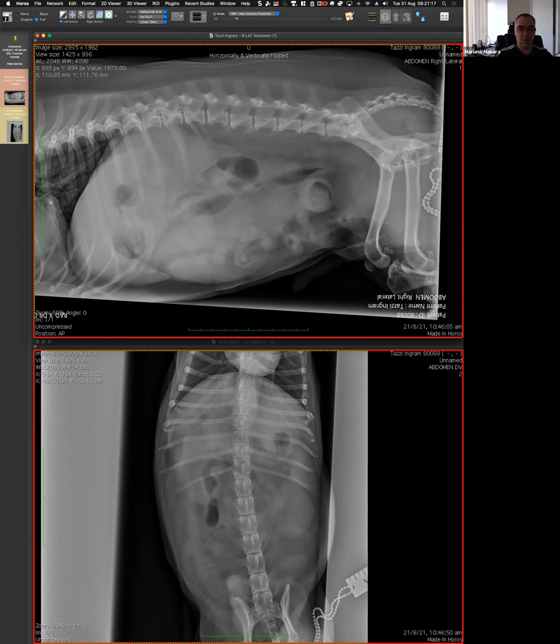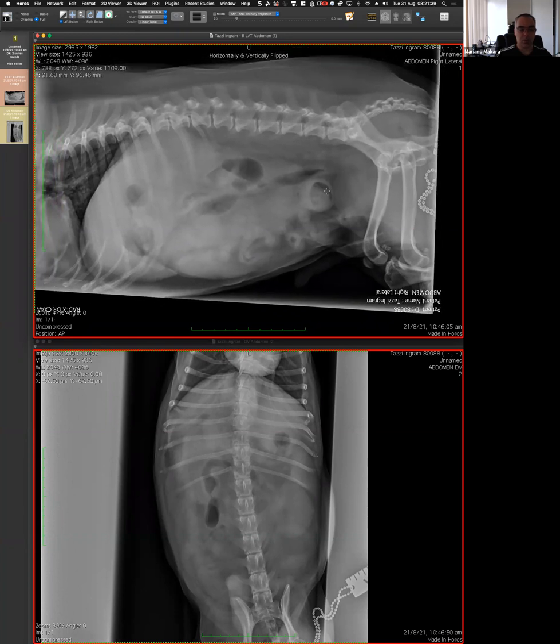Is there anyone willing to take on that and try to say you agree or disagree or support that, and try to push that idea about this? Or what could it be? So we said it looks odd. I don't know if I can continue that with this tubular structure. So even though we have those difficulties, what could it be? Can we hypothesize, even if it's not a perfect situation?